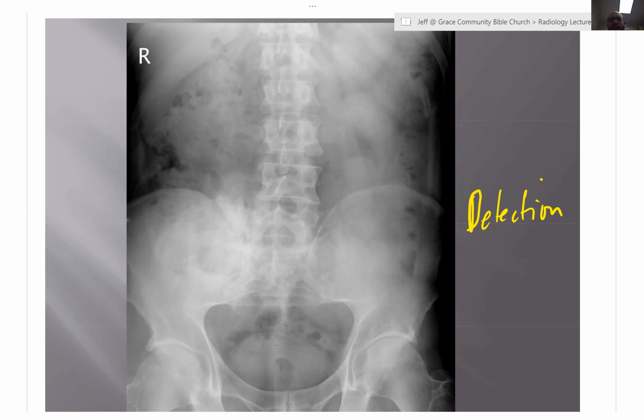Okay, so anybody wants to start talking and shout it out, go ahead and do so. Otherwise, I'll just do it myself and tell you what I thought was strange. Just to the right of the lumbar spine and into the pelvis. Excellent. Okay, I agree. That's all we need for detection. Just to the right of the lumbar spine, into the pelvis.